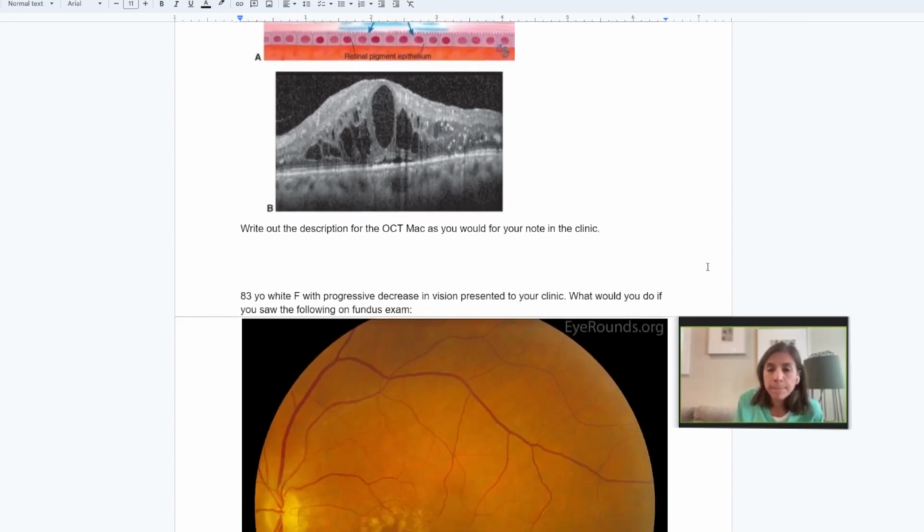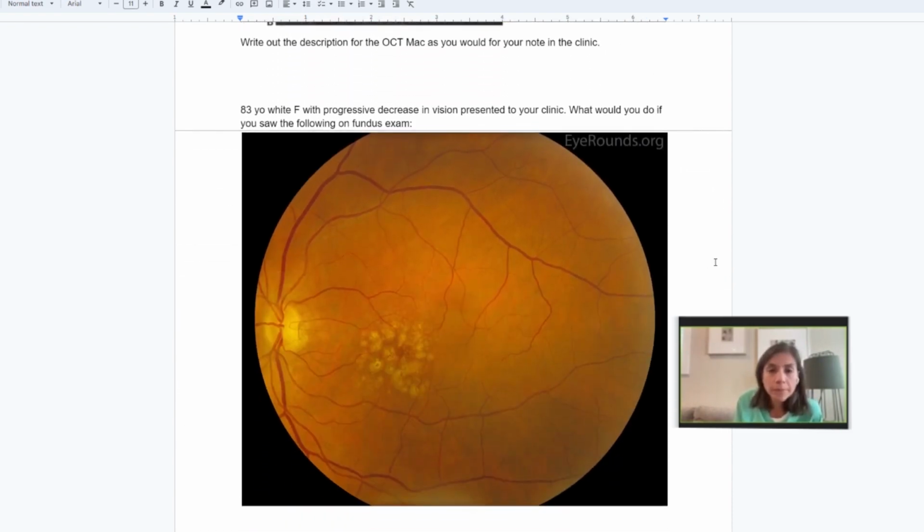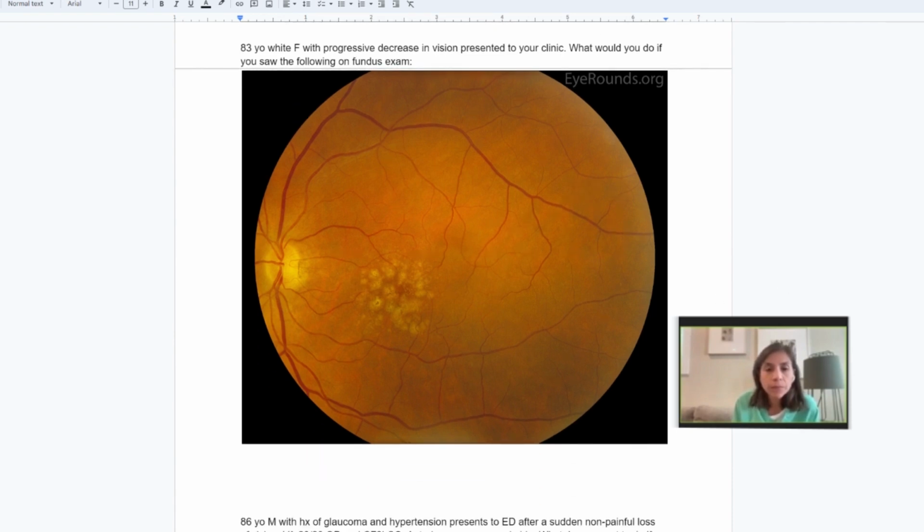Okay. And then contrasting this patient to this next one, we have these more flat-appearing yellow lesions. Flatter in color, not necessarily in the retina itself. And then I'm given some demographic information too. What do you think of this eye compared to the diabetic eye that we saw, or patient with diabetes in the previous photo? Sure. So, a few things to note: this is a left eye as opposed to the previous patient with the right eye.